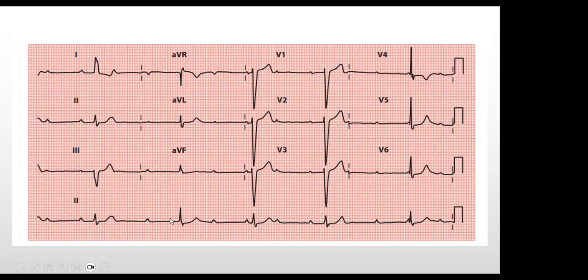It's definitely a ventricular bradycardia. I quite agree with you that there are elements of complete heart block with junctional escape rhythm. But again, if you look at the S wave in lead 1, you've got some deep S waves in V1, V2, V3. Then you could see the pattern in lead 1. So this patient, apart from having complete heart block, has some form of LBBB.